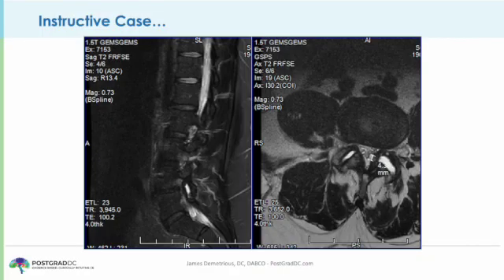This is an MRI of a 52-year-old gentleman who presented to my office with acute lower back pain and L5 radicular symptomatology. Most notably, the patient had 4/5 weakness of left foot dorsiflexion, for which he underwent neurosurgical evaluation and this MRI. The neurosurgeon strongly suggested surgical intervention.